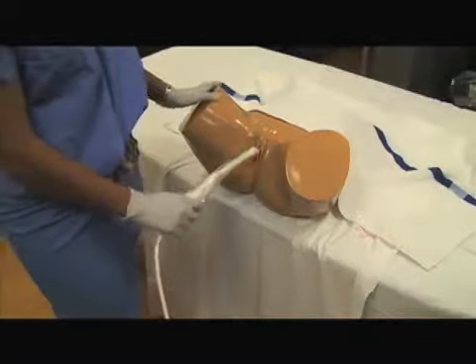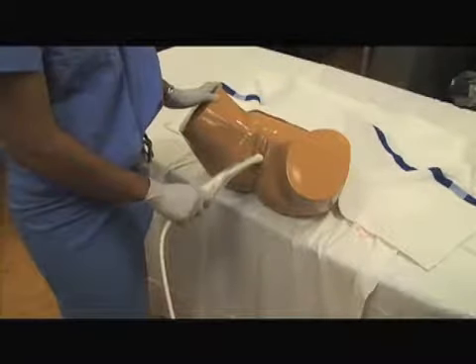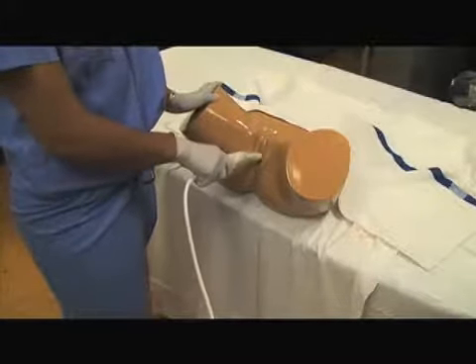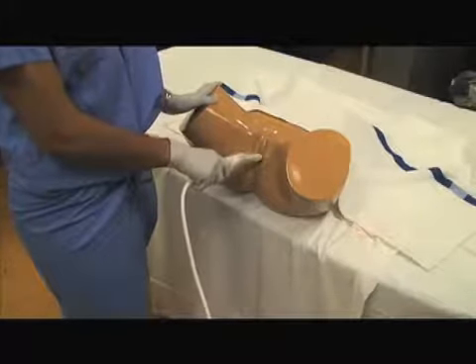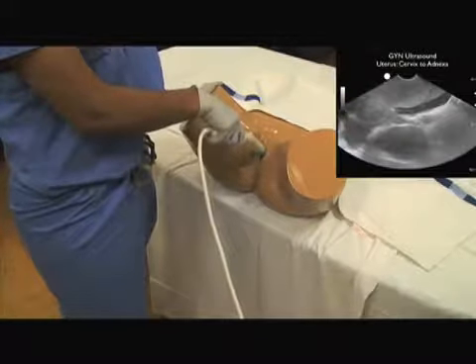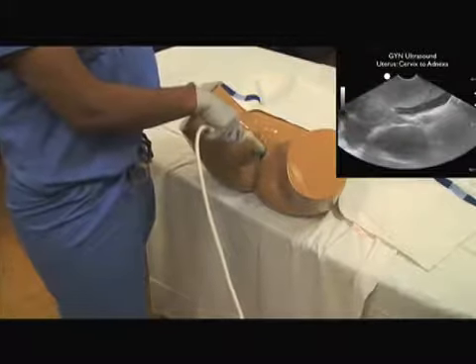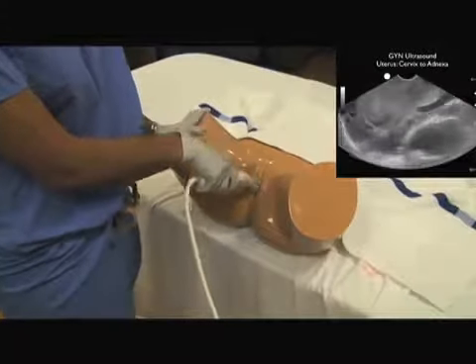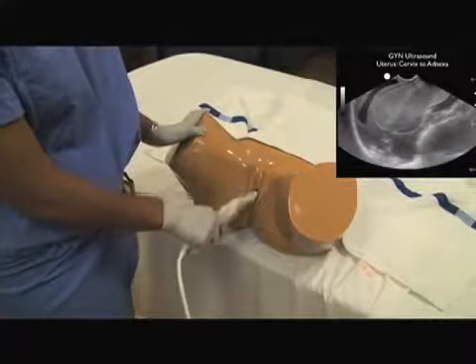We'll begin here by inserting the probe in a long axis configuration. Notice here the probe marker is now towards the ceiling. We're using some simulation equipment here that allows us to simulate using GYN phantoms for ultrasonography. We'll begin by visualizing the cervix, and notice that the hand needs to come very high up in a vertical plane to visualize the cervix as it's more posterior.